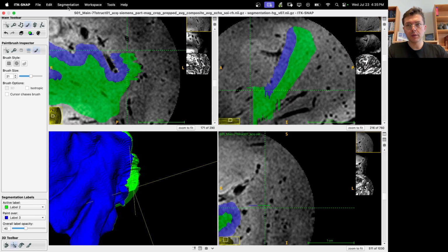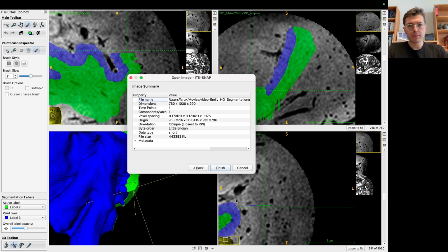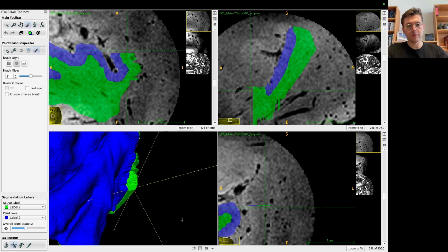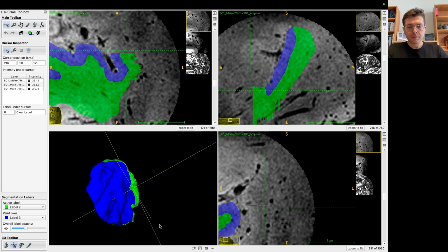E007 polish, let's load it. Okay, this is good.